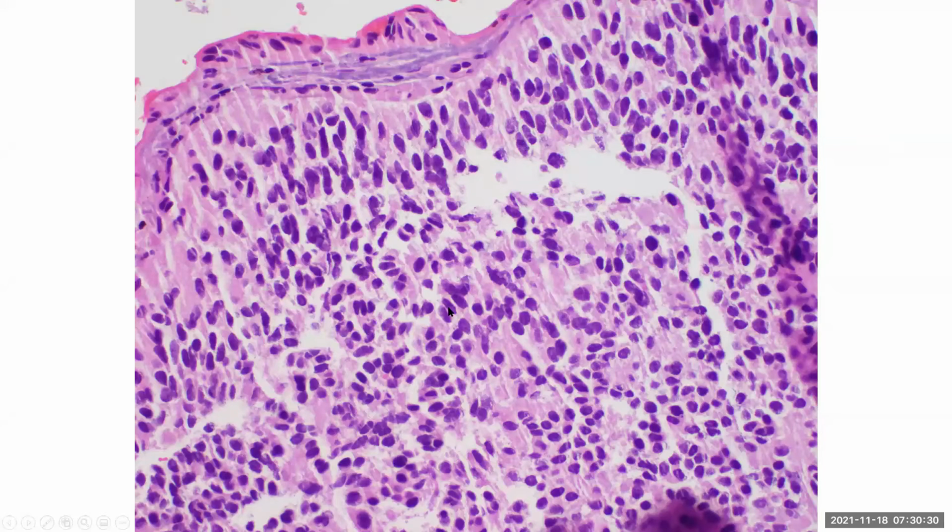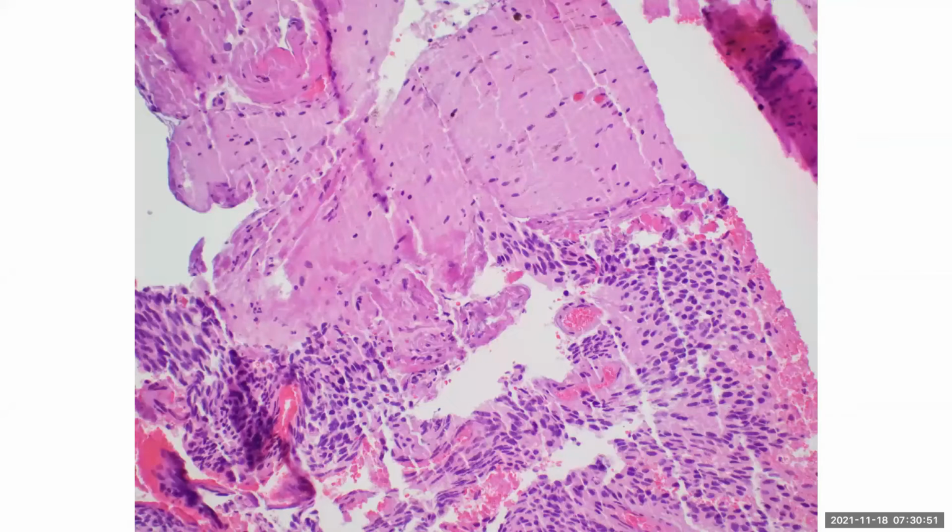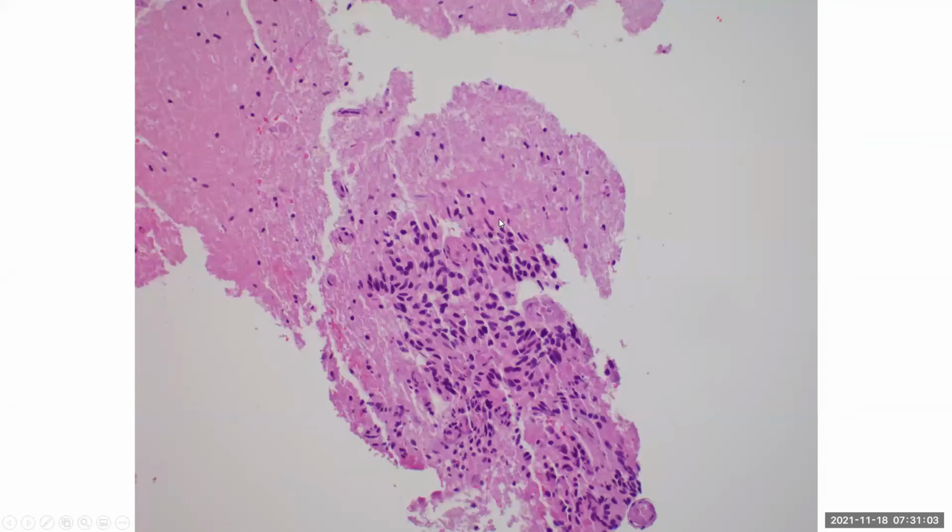Okay, so this is the tumor at low magnification. This is what we call basically a blue cell tumor. What does this mean? It means that the tumor cells have very scant cytoplasm. You can barely see any cytoplasm in the tumor cells, and the nucleus is hyperchromatic. That's why it appears blue. Given the presence of multiple recurrences and multiple surgeries, it is not a surprise that the tumor is poorly circumscribed. This is the adjacent non-neoplastic brain, and you can also appreciate brain invasion here into the adjacent brain.